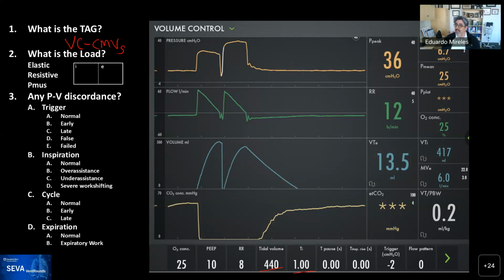Mm, I like it. All right. There's a lot of interactions here. Good. So obviously, I'm going to walk you through this so we can go through it. So let's start with the load.